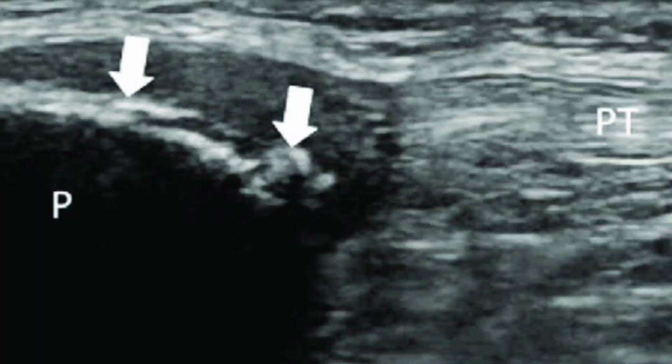Ultrasound can be a very useful tool here, indicated by these white arrows. This is the patella and the inferior angle of the patella showing slight fragmentation, small detached fragments of bone, where the patellar tendon attaches. This is the patellar tendon clearly depicted on another image. So this is a clear pattern of the disease, where you can see the ossification and the thickening at the point of insertion at the proximal end. Ultrasound is very informative and gives you clear detail of the tendinitis.